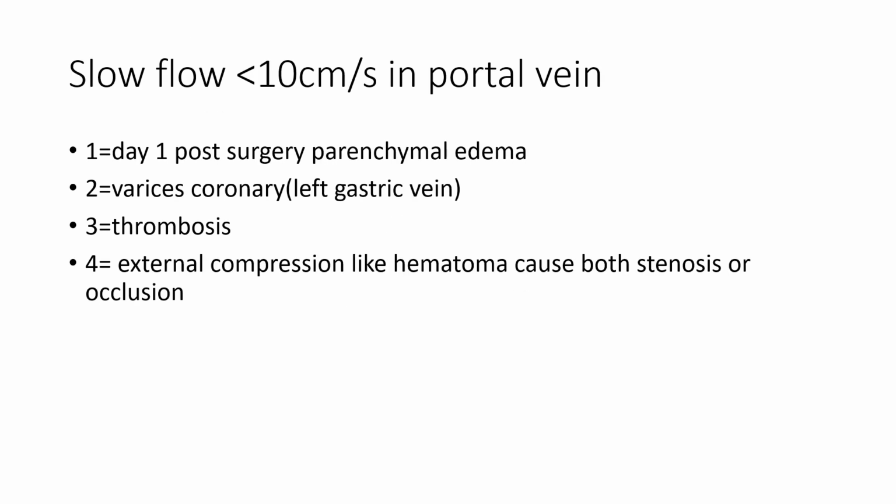A slow flow less than 10 centimeters per second in the portal vein in the first day after surgery is normal due to parenchymal edema. We should repeat it, and it should come up to about 30 to 40 centimeters per second.